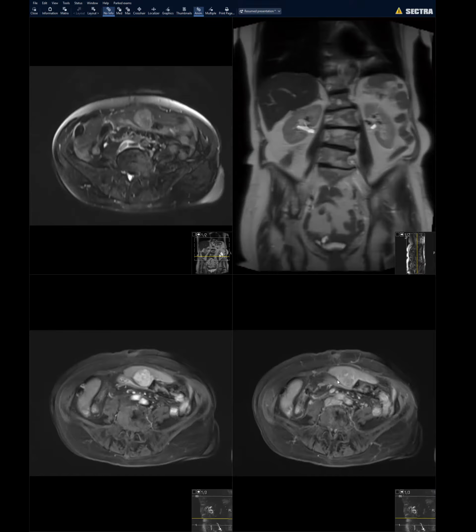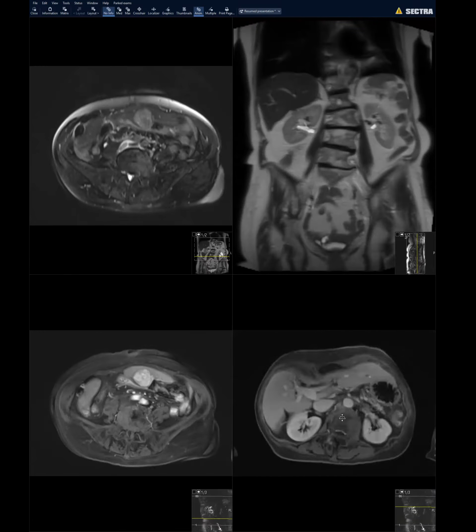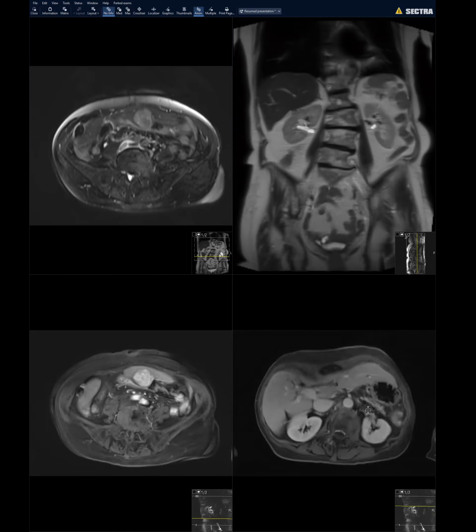And over here at UMS, we look at a lot of cases of myeloma, and we get to see a lot of extramedullary disease, and extramedullary disease in the liver can look similar. They're arterially enhancing lesions. The only difference is they don't show a whole lot of washout. They tend to stay enhanced. Occasionally lesions can have central necrosis, but they don't show a nice washout and a pseudocapsule like this lesion is showing. So complex history: pancreatic cancer, Hep C positive, and multiple myeloma. She also had multiple myeloma.